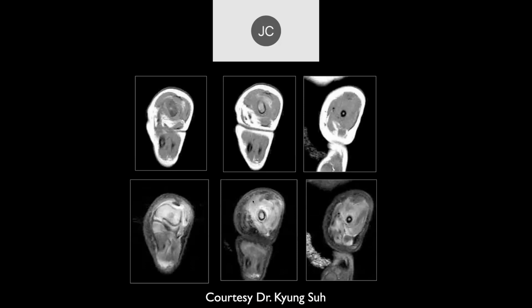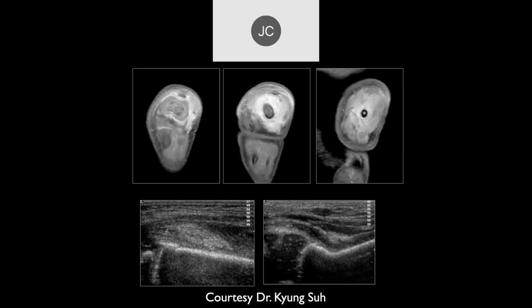This patient presented with anterior knee pain, and this was all an overuse injury to the quadriceps muscles, and this was all muscle edema from overexercise.